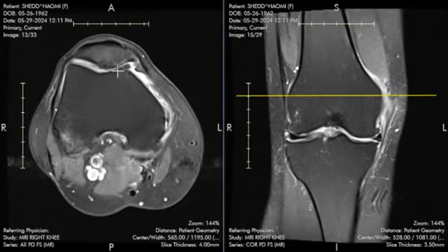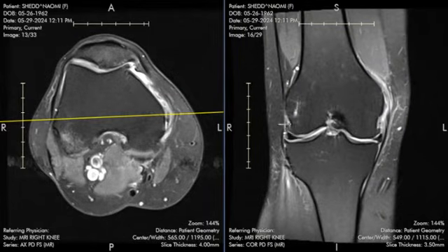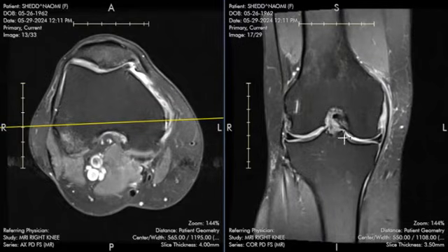It also has some mild edema and fibrocystic change. And then although there is marginal spurring at the lateral and medial compartments of the joint, there's no significant cartilage thinning here. So this is only considered mild osteoarthritis.